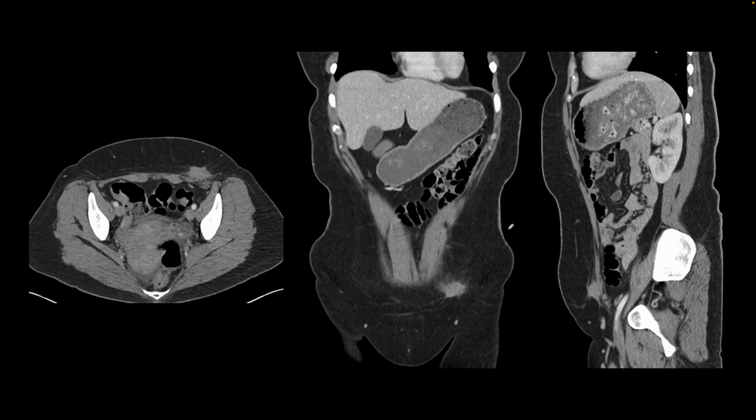All right, this is a young female who presented with abdominal pain, and on their CT we find this enhancing spiculated focus in the subcutaneous location abutting the abdominal wall in the left lower quadrant, seen like this on the coronal image and also on the sagittal image. This is a characteristic location for endometriosis, which is also called scar endometriosis from prior C-section.